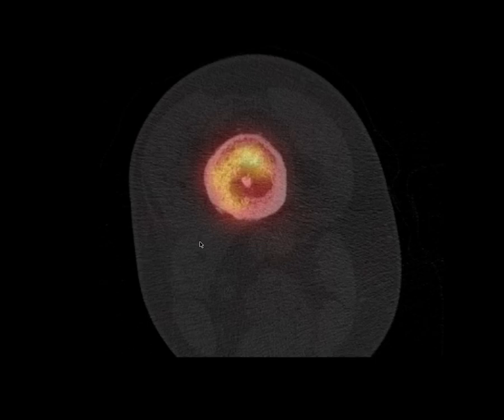You can do SPECT CT in the hip or the knee replacements, especially if you have a CT scanner with metal artifact reducing features, but often it's not that good because of the artifact from the metalwork. We try and do these routinely in patients with chronic osteomyelitis, especially where the metalwork has been removed, because we might be able to see things like sequestra or cloacae or abscesses around the bone. So here's a dense focus of bone, which may be a sequestrum. There's quite a lot of activity here, obviously.